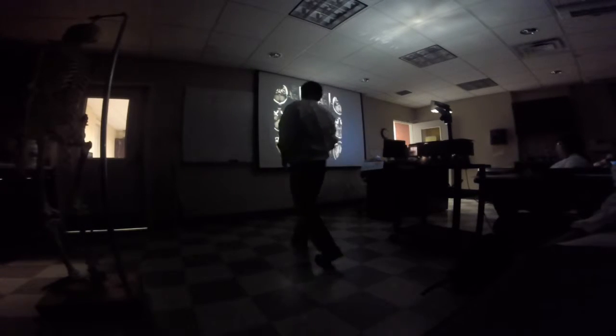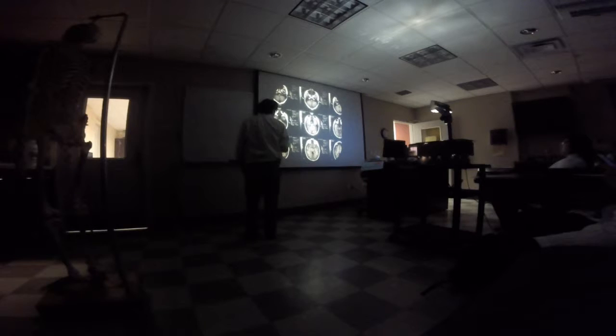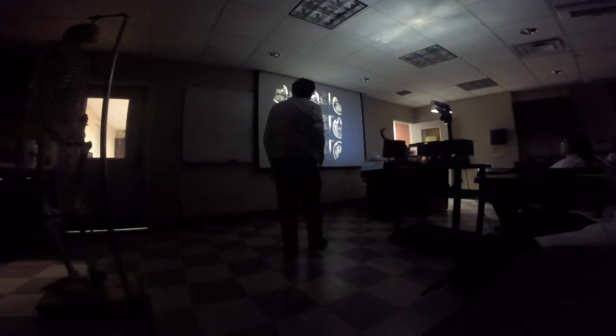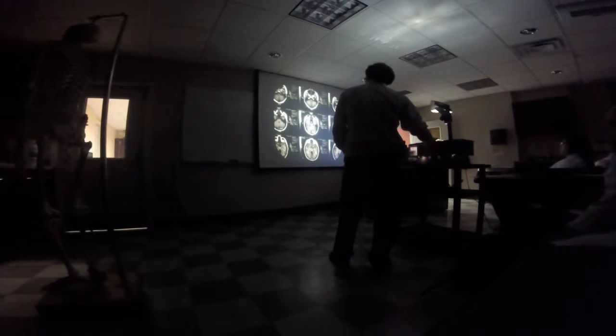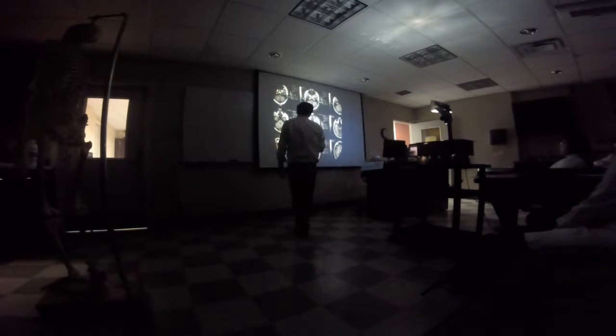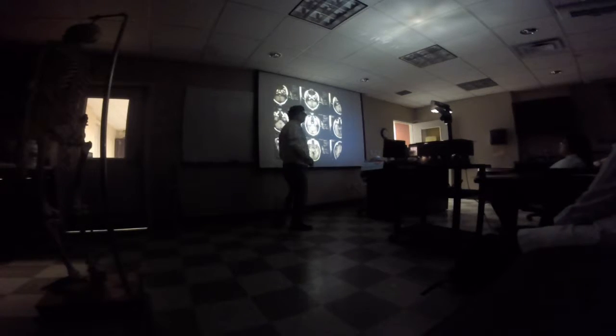Okay. What do we see right here? Cerebral aqueduct. No, it's a little too big for that. It's between the pons and the cerebellum. What is that chamber between the pons and the cerebellum? Fourth ventricle. The fourth ventricle. Is it also pictured in the middle, right? Yeah, it's not as prominent here. It's starting to expand here.